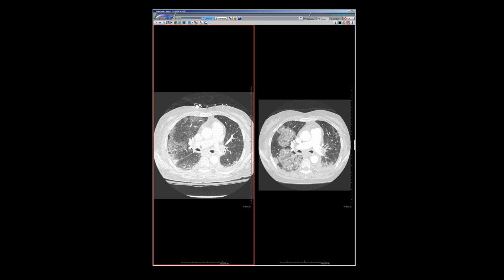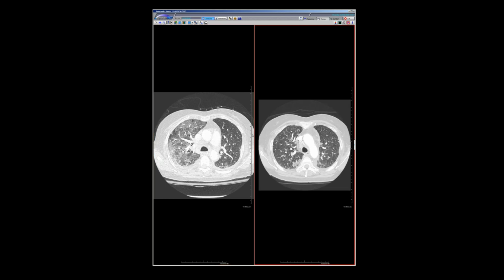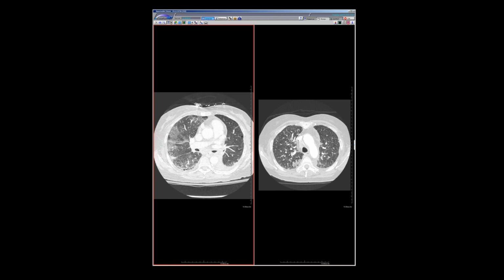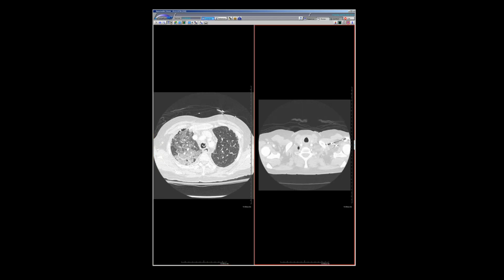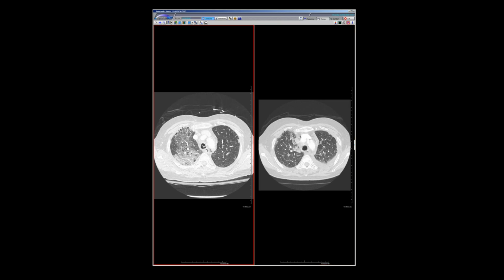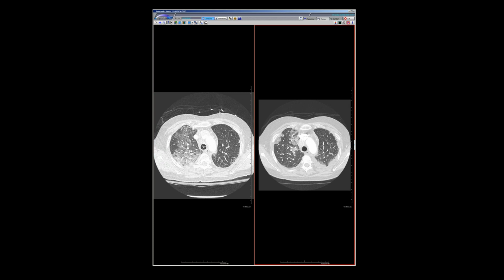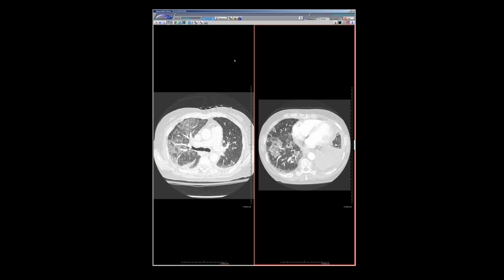You think maybe something like edema, but even that is odd. There's a little septal thickening, but the left lung is relatively spared. And she has tumor there and narrowing there. I don't know. Inhalational injury, decreased airflow. I have no clue. It's just really odd, and the rapidity of how it comes in, it literally is just like the photo negative of it. It's weird. All right. Sorry. Interesting.